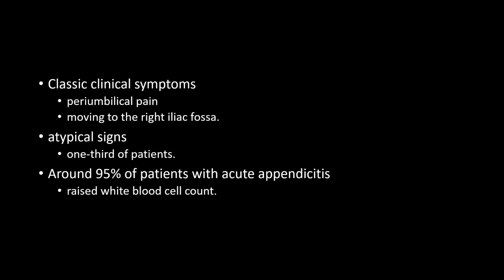We can see an appendicolith, we can see an inflamed appendix, and we can see fat stranding, a classical case of acute appendicitis. What are the things that we have to keep in mind whenever we see an appendicolith? Always look for the central halo sign, which is seen in the case of a phlebolith. Also in an ultrasound, the combined wall thickness should be more than 7 mm.